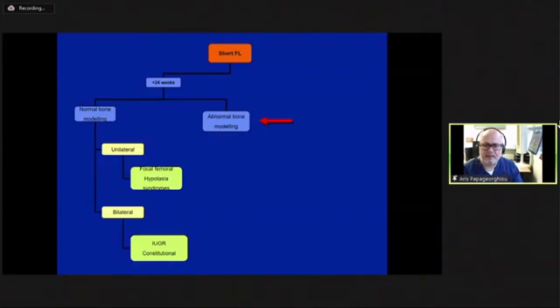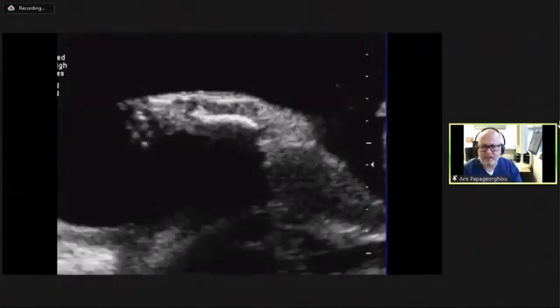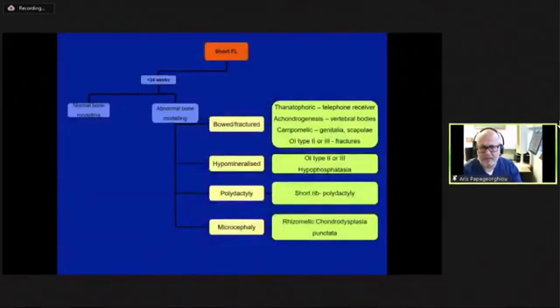Let's then look at babies with abnormal bone modeling. Abnormal bone modeling can be a variety of things. So just have a look at these images. Here's a femur, and you can see that right in the middle of that femur is an acute angle, suggesting perhaps a fracture or some sort of bendiness. Be careful when trying to distinguish bendy bones from fractured bones. This is another case here. You can see that the soft tissues seem almost too large for the bones. Here, this is much more convincing of a fracture, isn't it? Where you have a real angle right in the middle of the shaft of that bone.